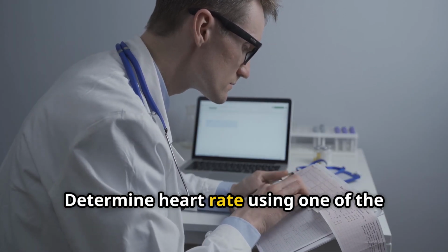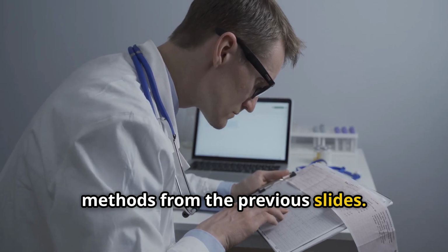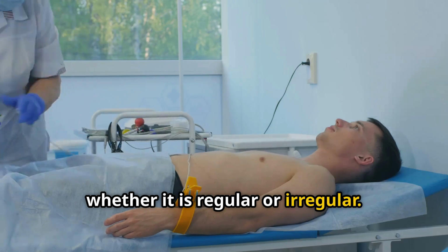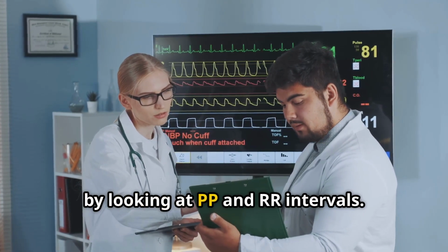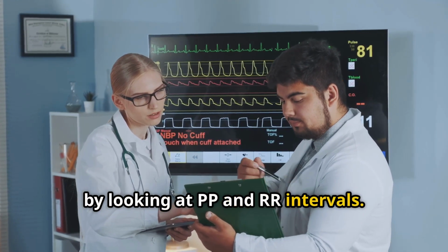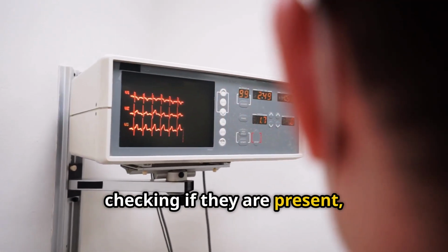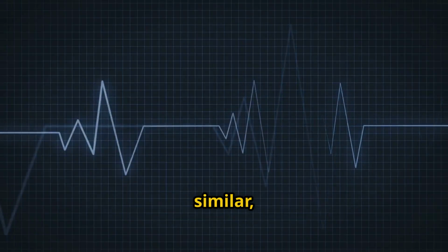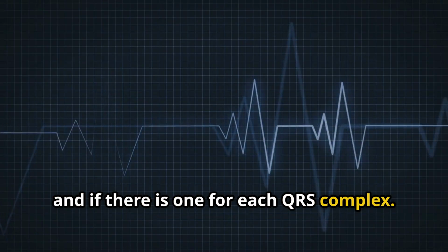Determine heart rate using one of the methods from the previous slides. Determine regularity, whether it is regular or irregular. Assess atrial and ventricular regularity by looking at PP and RR intervals. Analyze P waves, checking if they are present, regular, consistent in shape, similar, and if there is one for each QRS complex.